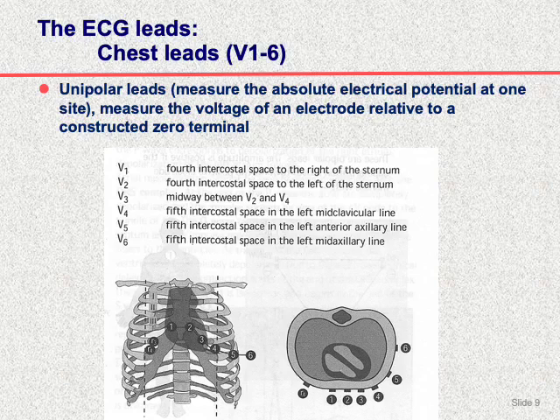We also have 6 limb leads looking at the heart in a vertical plane, from down, laterally, and to the left and right. So this is the idea of leads. Why do we have 12 leads? To look at the heart from different planes, vertical and horizontal, and from different directions, so we can know which vector and which axis we can calculate. So these are the basics of ECG: ECG leads, ECG paper, the origin of the waves, and definition of the waves.